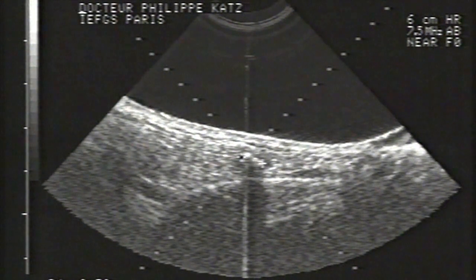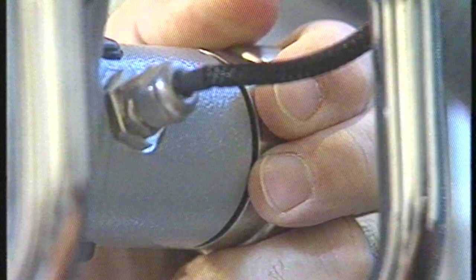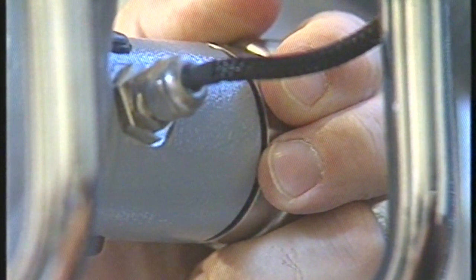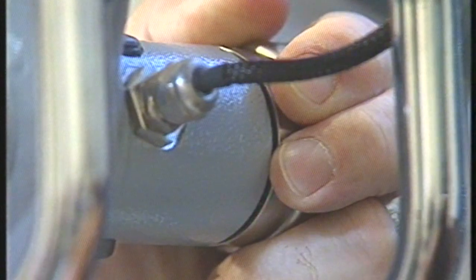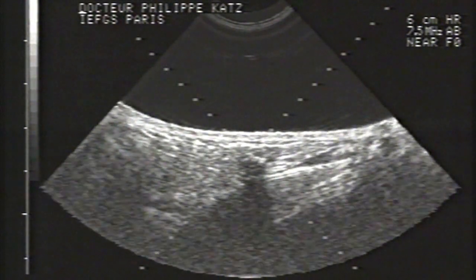With an intraglandular infection, extracorporeal shockwave lithotripsy is not performed. An antibiotherapy is then prescribed for at least 5 days before the lithotripsy session. Also, in case of hemostasis trouble, this type of lithotripsy is contraindicated.